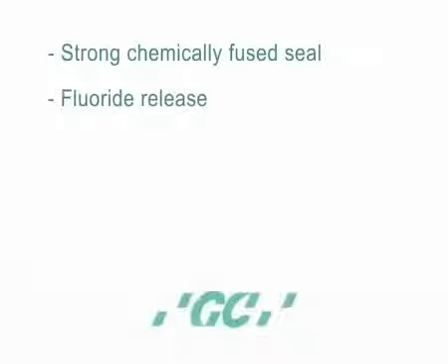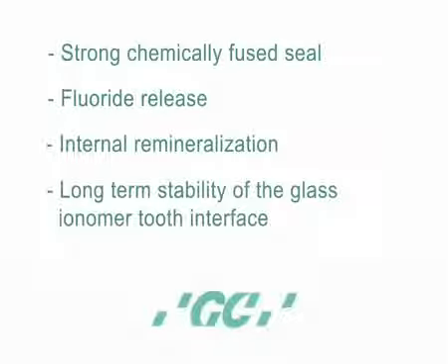Glass ionomer cements continue to increase in popularity, offering many important benefits for clinicians and patients. Let's look more closely at what happens when we mix and place a glass ionomer cement.